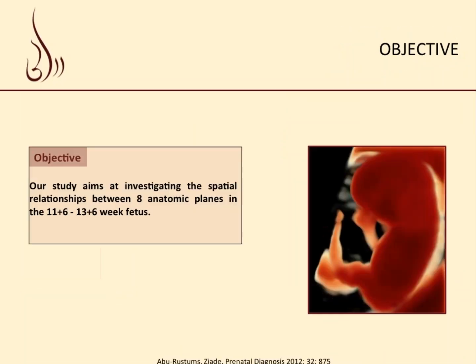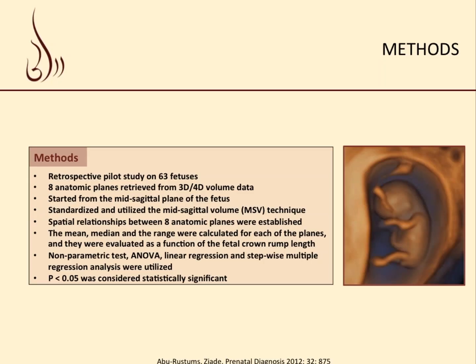And we tried to look at this several years ago in 2012, where we tried to investigate the spatial relationship between 8 anatomic and biometric planes in the 11 to 14-week fetus. And so this was a retrospective study on 63 fetuses on whom we had stored 3D, 4D volume data sets, all obtained from the mid-sagittal plane.